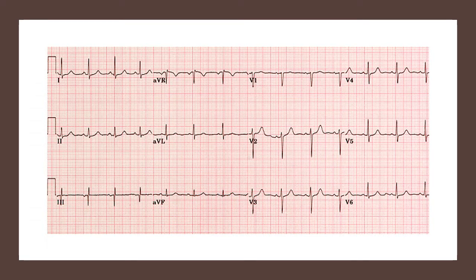and you can see that here. So there's no R wave present in V1, then there's a little bit of an R wave in V2, it's getting bigger in V3, it's now transitioned to isoelectric, maybe tipping the scales over to being positive. V5 is clearly positive, and in V6 you have almost no S wave left, it's almost completely upright, and your T wave is upright. And so that is a normal presentation. Okay, so let's look at what happens when we incorporate a bundle branch block into that ECG presentation.